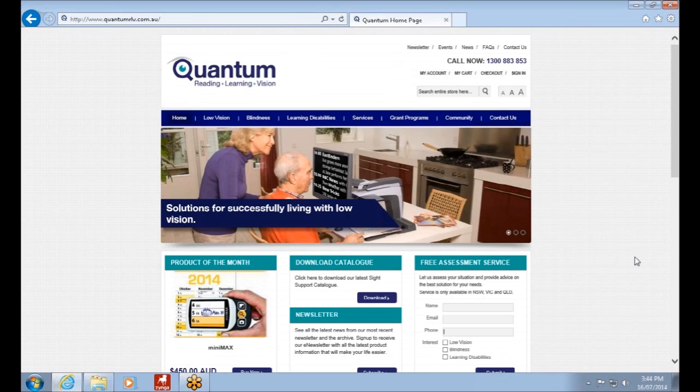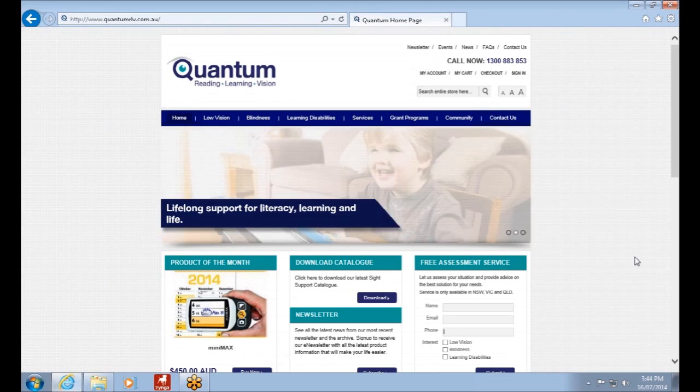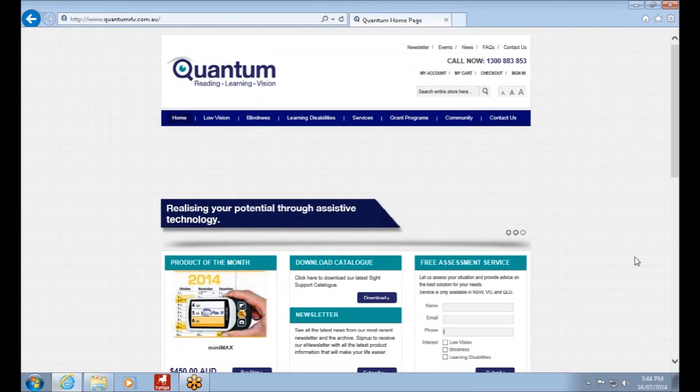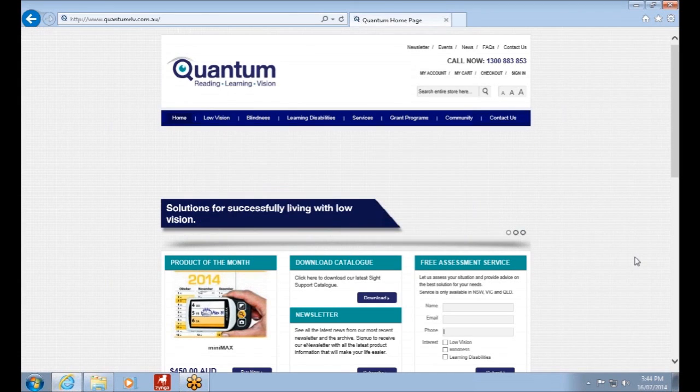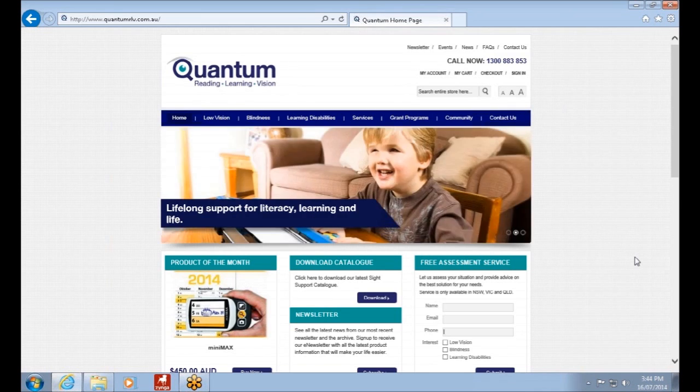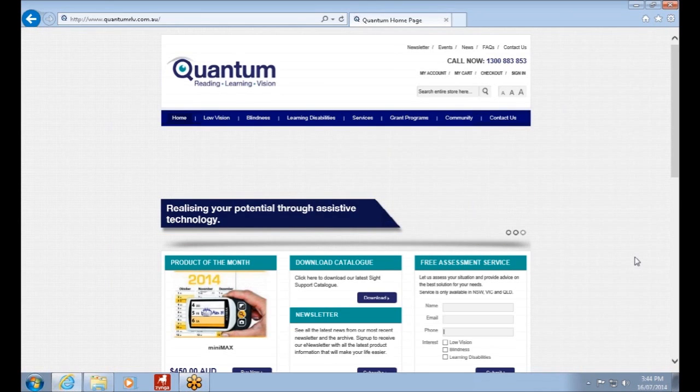I don't know why you would want to do that, but the option is there if you wanted to. But JAWS is smart enough that if you get onto a website, the virtual cursor mode is automatically turned on. You don't have to worry about turning that on. Where it's needed, it comes on automatically. So when a website reloads or when you actually change to another site, JAWS makes the assumption that you no longer want forms mode, so it turns it off, which in most cases is generally correct. You would very rarely ever want forms mode to carry on to a whole new page.